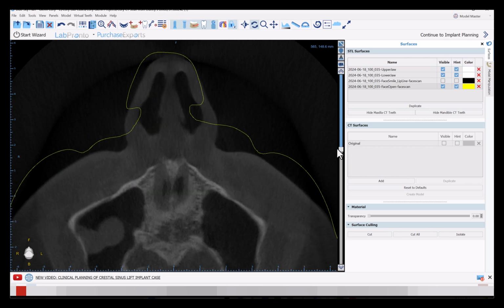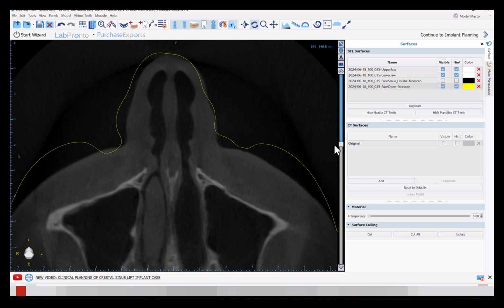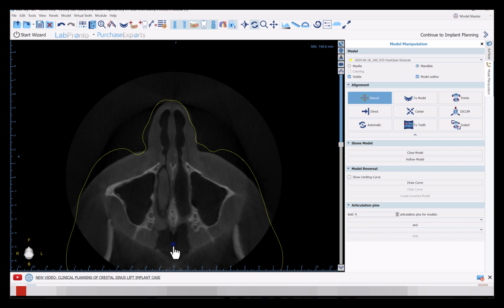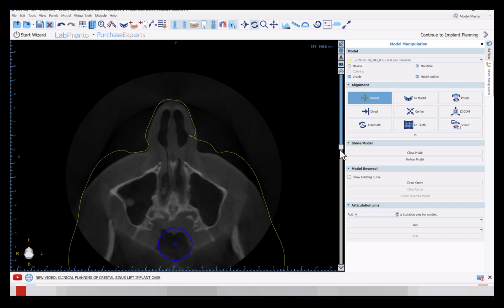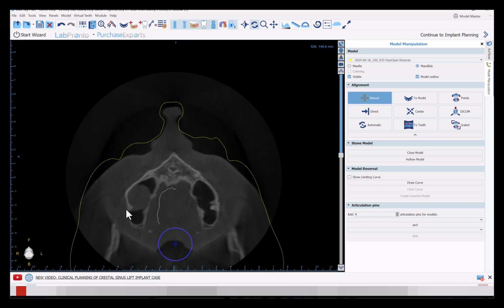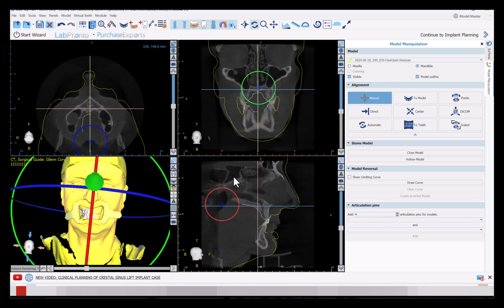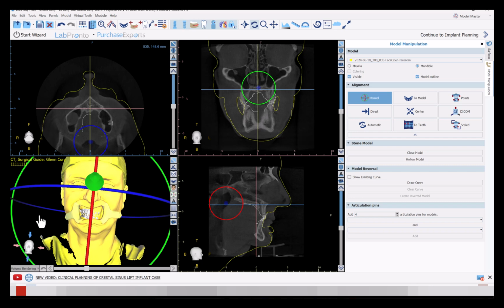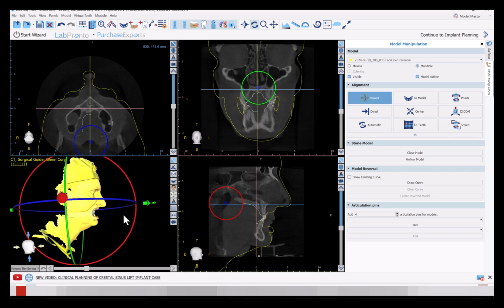Now the nose ought to be somewhat matched up, and I see that it's not either. So now you get left with this dilemma of trying to fine-tune this based on model outlines, right? Trying to drag this over, scoot things up or down. And I find it useful to hit F5 and go to this MPR view because that gives you some different views, like a true cross section through the head that I can look at.